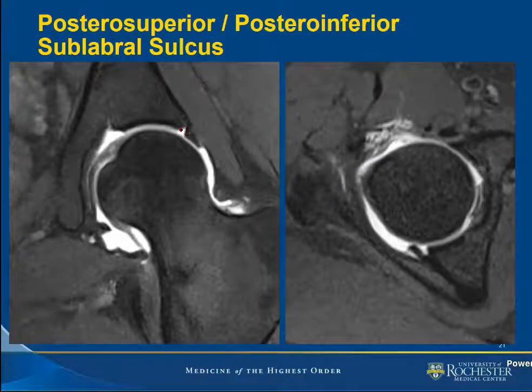Essentially, if you're seeing tears involving the posterosuperior acetabulum or posteroinferior acetabulum, you want to see extension of the tear coming from the anterosuperior or superolateral acetabulum, propagating posteriorly, almost like a SLAP tear of the shoulder, rather than an isolated tear of your posterosuperior or posteroinferior acetabular labrum, just because the statistics are not in your favor if you're saying that. And this triangular morphology is the tip-off that you might be dealing with a normal variant rather than a true pathology.